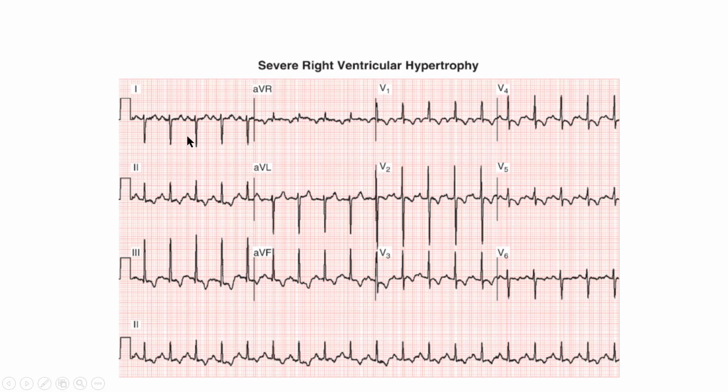If we look at lead 1, we can see it's negatively deflected and AVF is positively deflected. The upward thumb defines the axis, and so we have a right axis deviation. Next is going to be interval. Next is going to be the PR interval. We can see here that the P wave, the PR segment, and the initiation of the QRS complex all fit well with one of the intermediate boxes, and so it's going to appear normal.